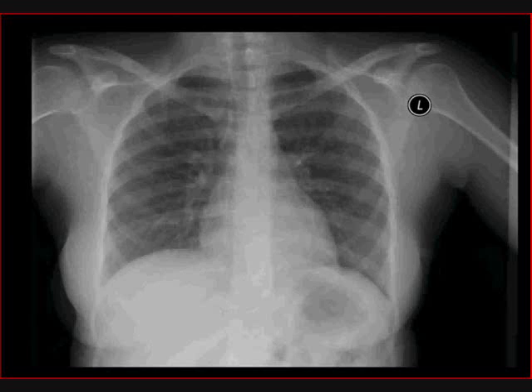The first thing to assess when reviewing a plain radiograph of the chest is, first of all, is this the right examination on the right patient performed on the date of interest? And then we also evaluate it for technical factors such as, is the penetration sufficient? And did the patient take a sufficiently good breath? So in this patient, we have a radiograph with good respiratory effort. It is more or less a technically sufficient study.